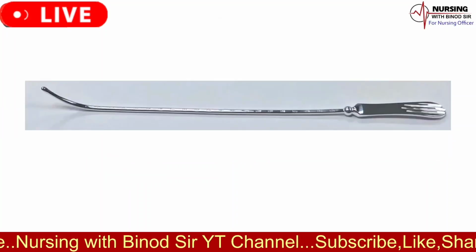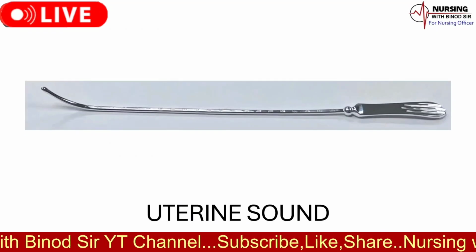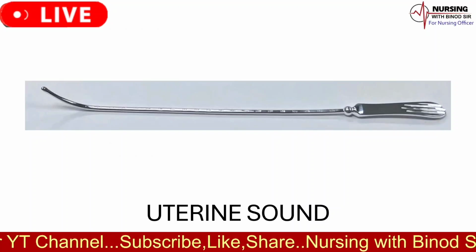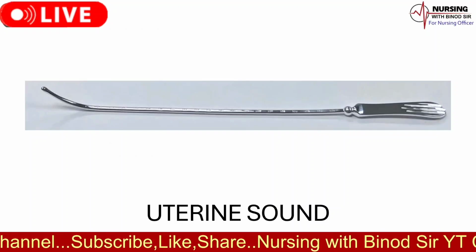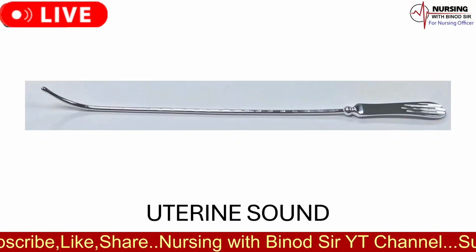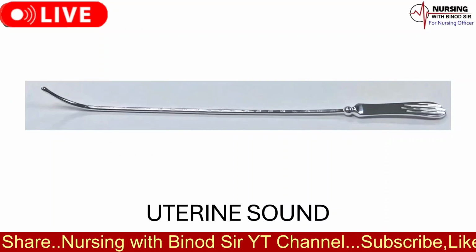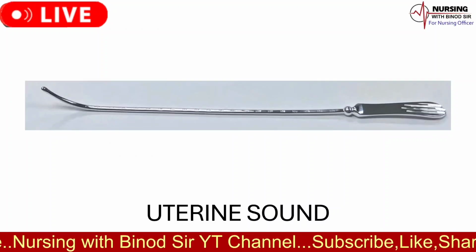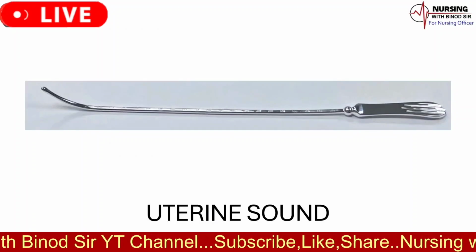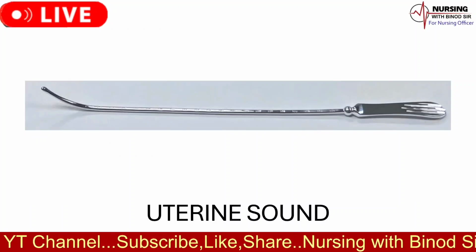The name of the instrument is uterine sound. It is an olive-pointed, graduated, malleable, metallic uterine sound. The uses of uterine sound are as follows. 1. To know the position of the uterus and the length of the uterine cavity prior to dilatation of the cervix in D+E operation. 2. To sound the uterine cavity to detect any foreign body, IUCD. 3. It acts as a first dilator of the cervical canal.